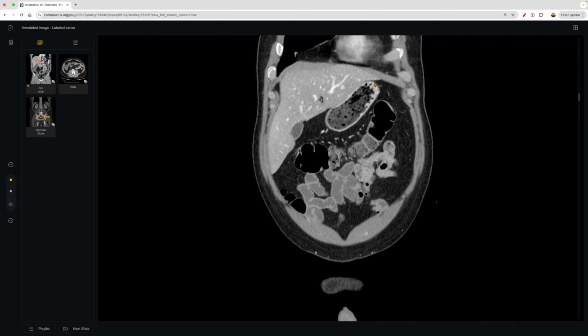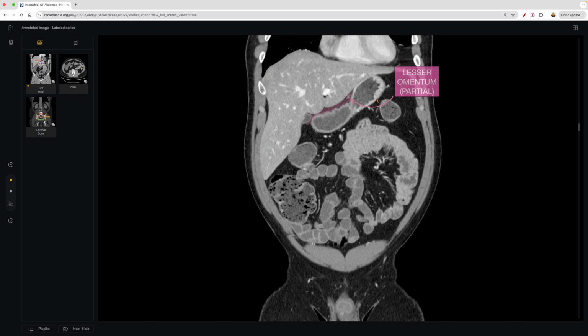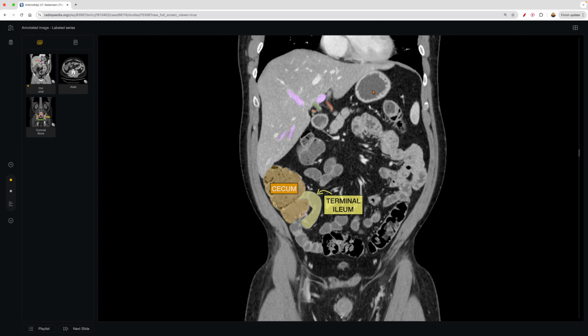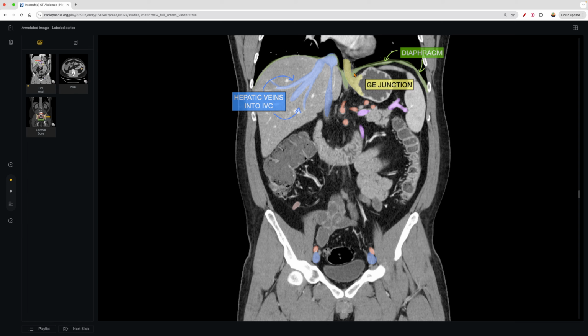And then you'll see next to it is the stomach. And the stomach, you'll see, has its rugae as well. And you can see that inside there, it gives it its unique appearance. You'll also notice that there are gastric contents, which is pretty common to see, but you typically don't see air as you would in the bowels here. So focusing on the stomach here, you can see where it comes in and where it goes through the diaphragm as well, which is important to take notice, as oftentimes there will be a sliding or some type of hernia.